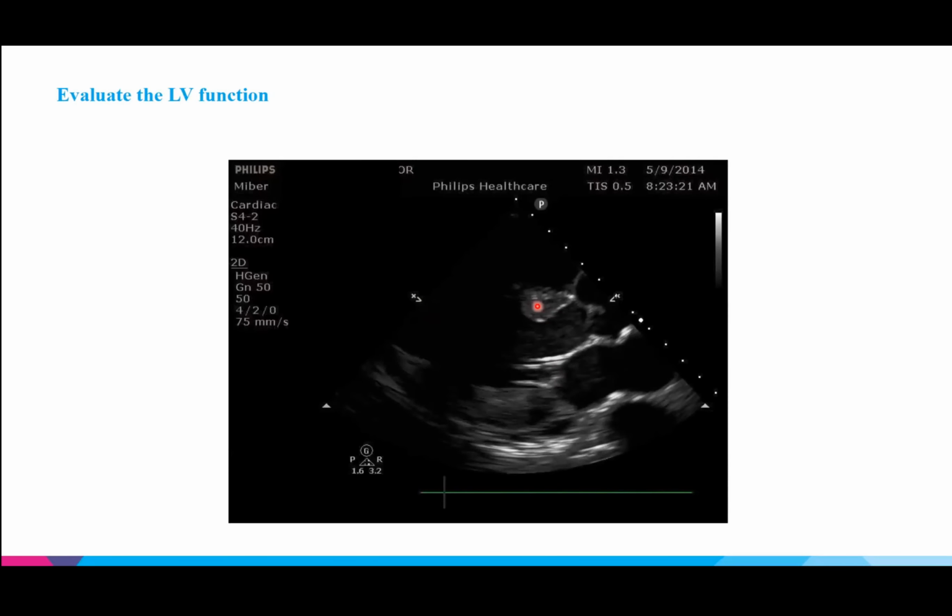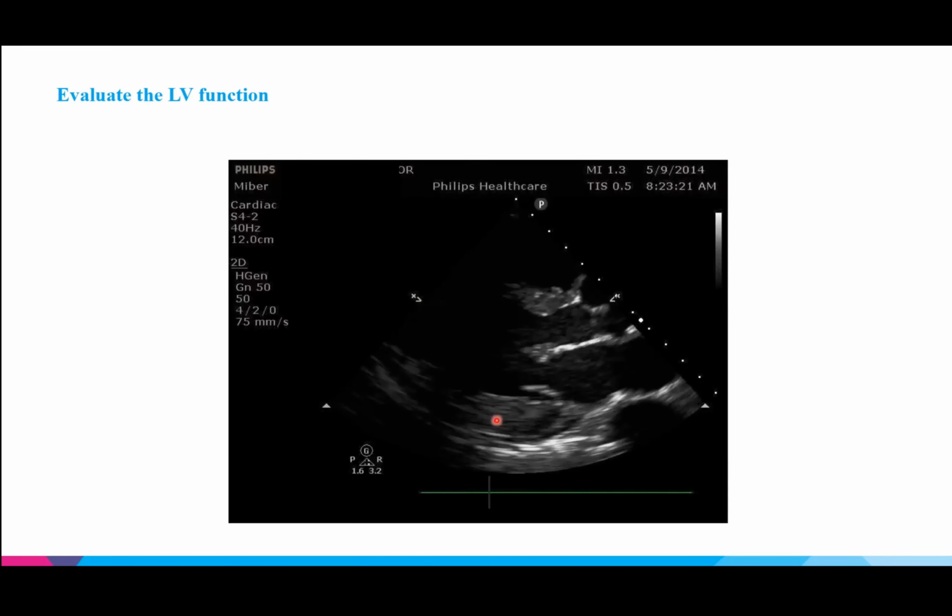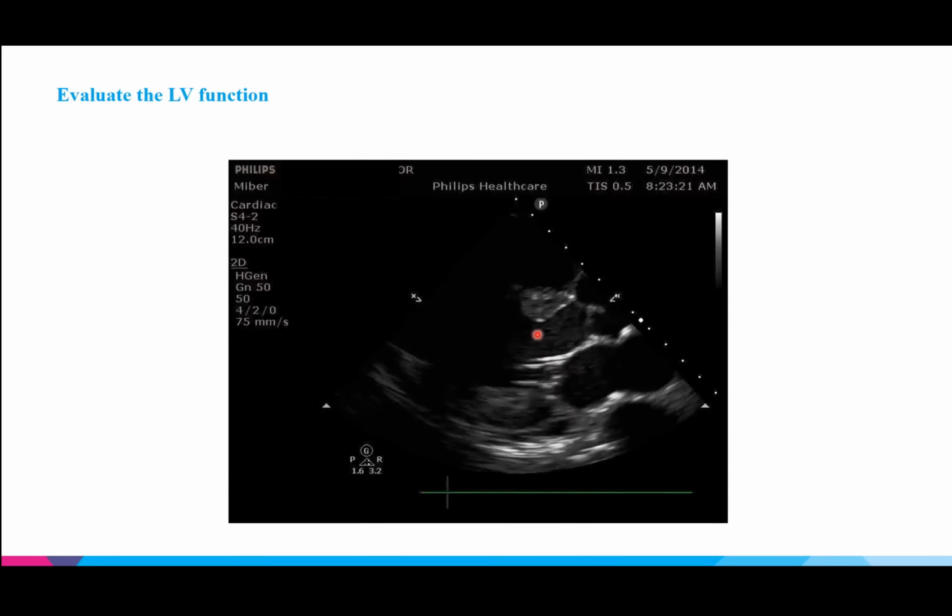And then what do we think of the movement? I look at the walls thickening with contraction and the cavity size shrinking. The cavity seems to be pretty much the same throughout the entirety of the clip. There's some movement as we get closer to the aortic outflow tract. And if we look at the anterior leaflet of the mitral valve, it barely moves up. It definitely doesn't cross midline, so it's even less than midline. So yeah, I would agree that this patient has severely reduced LV function. Excellent.